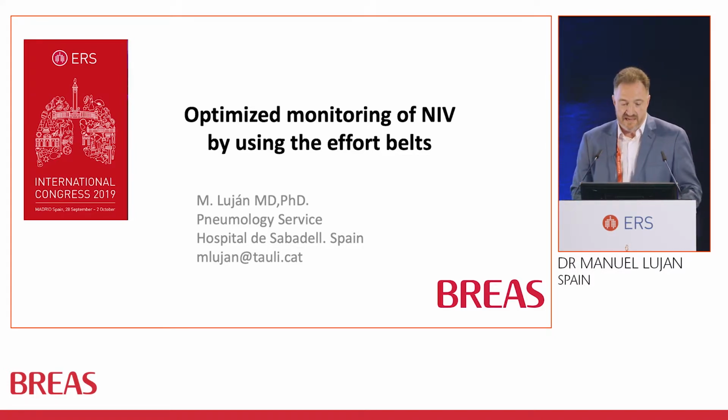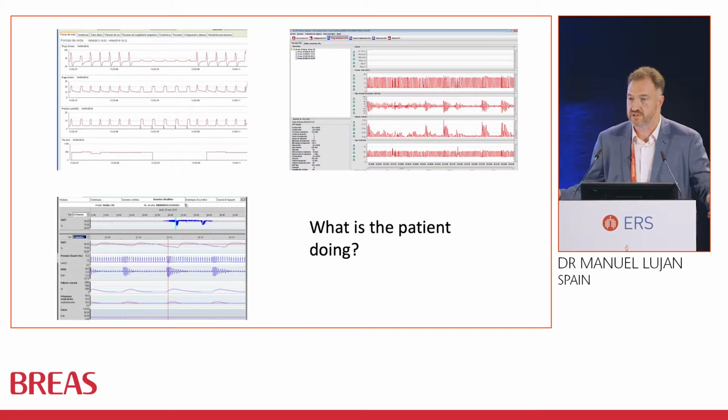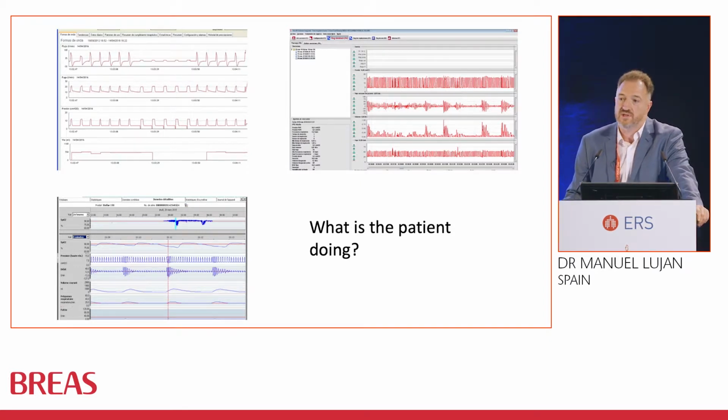I'm sure that many of you are familiar with using ventilator software, and I'm also sure that you always have to deal with tracings like these, complex tracings with periodic flow reduction. And the question you are probably asking yourselves when you see this tracing is: what is the patient doing? In other words, we need more information about the ventilatory pattern of the patients.